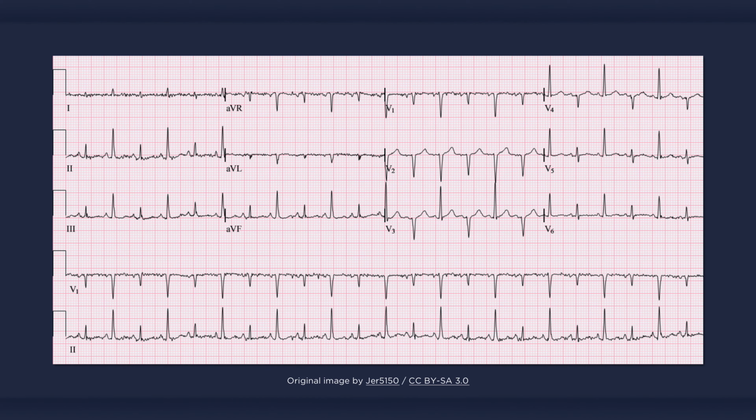The fundamental electrocardiographic sign of electrical alternans is the alternating height of consecutive QRS complexes. For example, take a look at leads 2 and V1 in the ECG. There are essentially two sets of QRS complexes that alternate from beat to beat. There is one set of QRS complexes with lower voltage, and another set with relatively higher voltage.